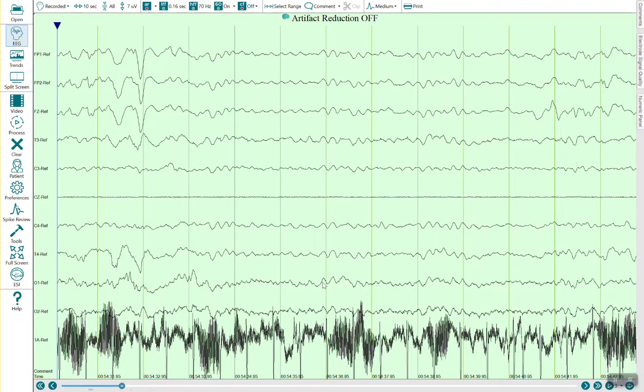This is an ad hoc screencast to go over the aEEG, or Amplitude Integrated EEG, measurements in PERSIST, how they're calculated, and how to get the information of those measurements out from the program in a couple of different ways. My name is Michael Guest, VP of Research and Clinical Applications for PERSIST Development. Let's go ahead and get started.